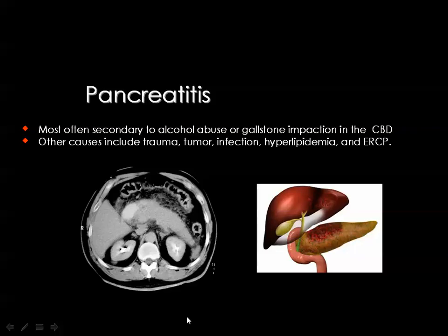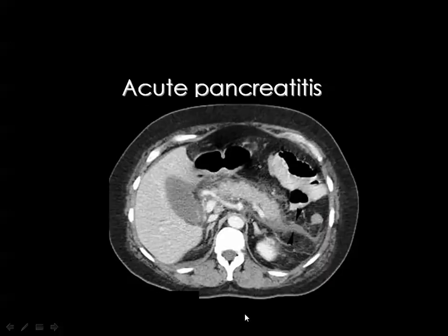Acute pancreatitis, one of the causes of acute abdomen, means that the pancreas is inflamed. And whenever the pancreas is inflamed, it will be swollen, and the peripancreatic fat planes will become dirty, or stranded, or smudged. And these are the basis for diagnosis of acute pancreatitis: swelling of the pancreatic gland, and hazy, strandy, or smudged peripancreatic fat planes. Then you may see some fluid which is the result of inflammation.